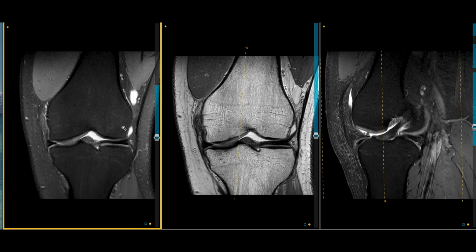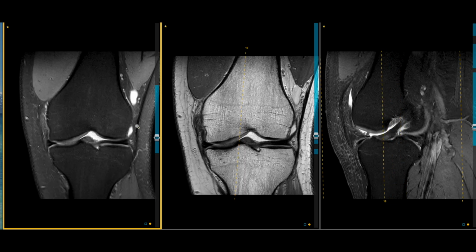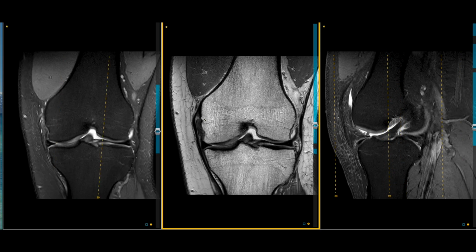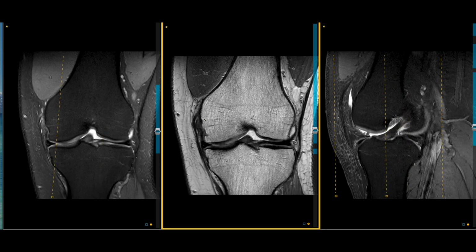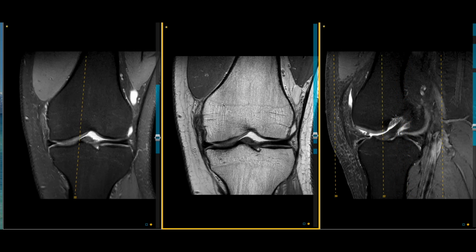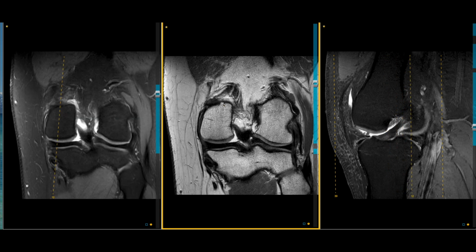This patient happened to have started with a significant displaced ACL with displaced tissue anteriorly and a large gap between the two ends of the ACL, hence resulting in a reduced thickness, elongated hourglass appearing ACL heal.